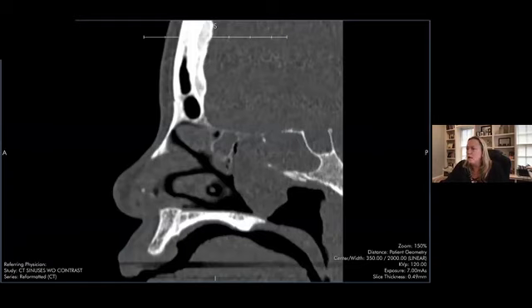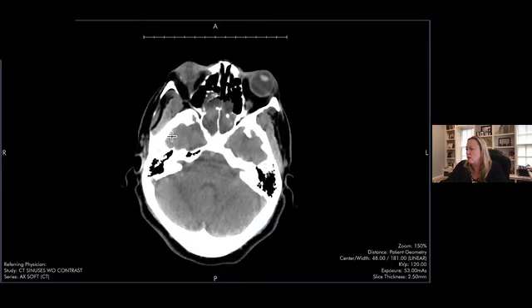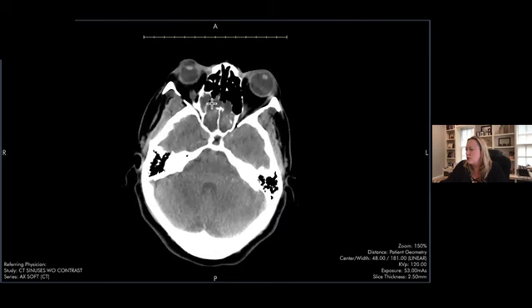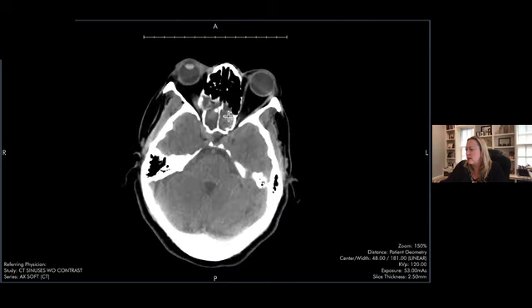Remember, every single sinus CT you should also reconstruct in a soft tissue algorithm. And I can't emphasize that enough. You want to look at your soft tissue windows, always look at your soft tissues around your sinuses, but also look at your brain on every single CT of the sinuses. And then on your soft tissue windows, some of this stuff is not really very low density. It's kind of intermediate in density.